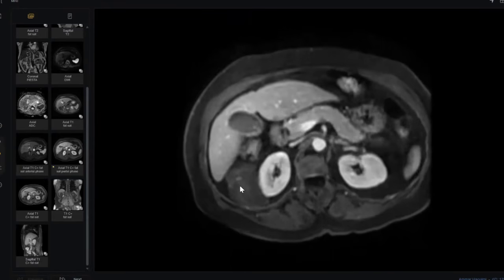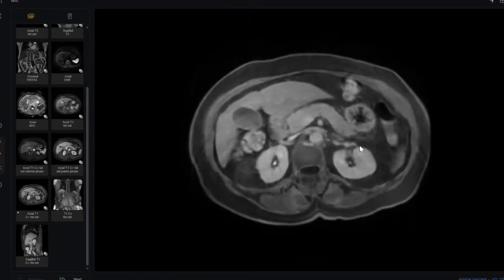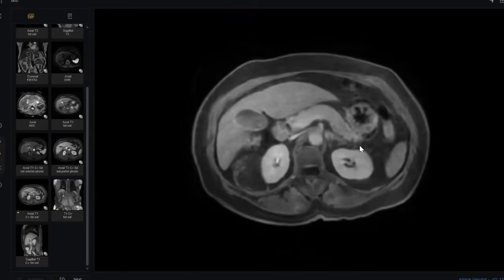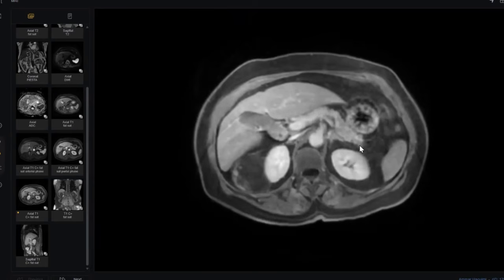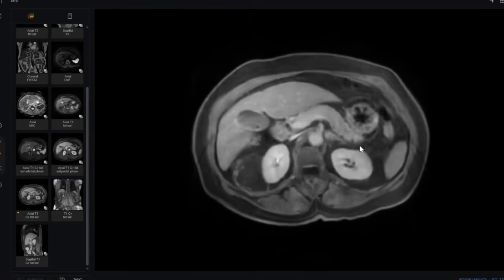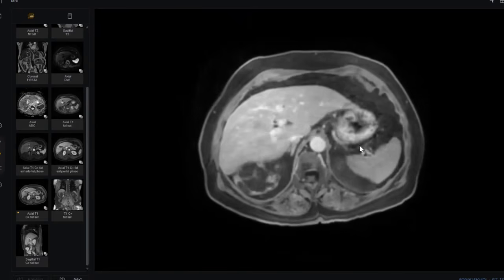Look, more increasing. Persistent progressive enhancement, which is a criterion for any vascular lesions or vascular containing lesion like hemangioma, AML, all of this. Okay, that is all. But the liposarcoma is poorly enhanced. Okay, is it clear?